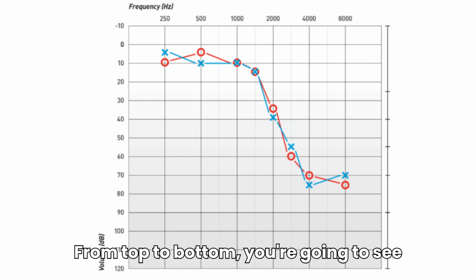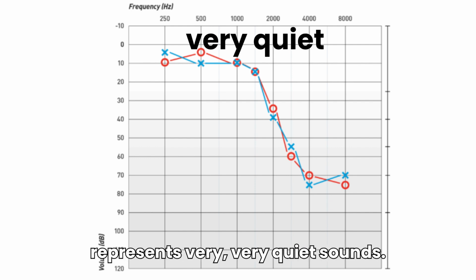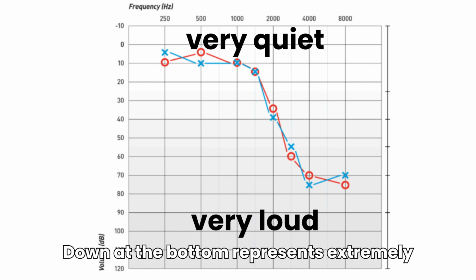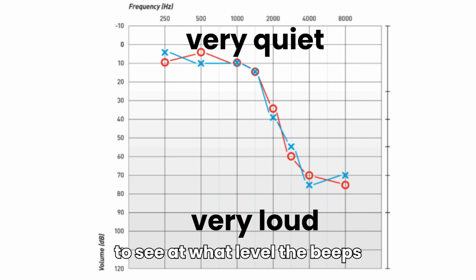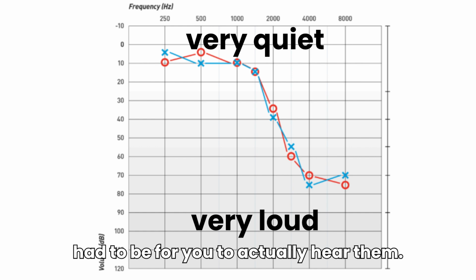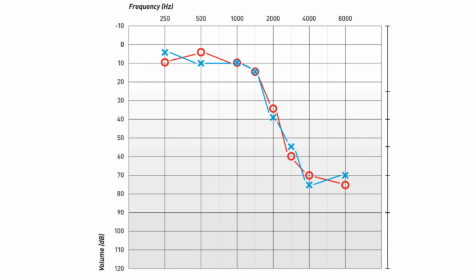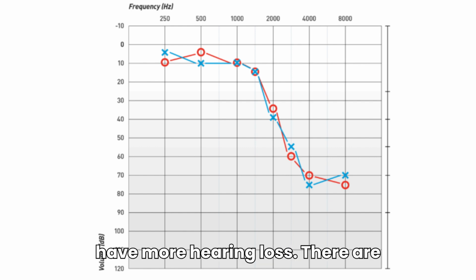From top to bottom, you're going to see loudness. Up at the top represents very, very quiet sounds. Down at the bottom represents extremely loud sounds. And then you're going to see at what level the beeps had to be for you to actually hear them. So anything closer to the top means that you have better hearing. Anything towards the bottom means you have more hearing loss.